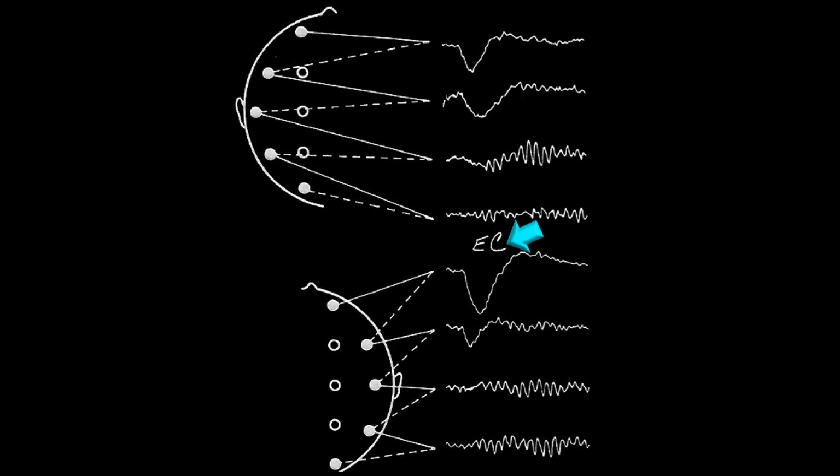In this frame, you can see the classic presentation of eye closing. It is a downward deflection in the anterior-most electrodes when we use a banana montage. Simultaneously, you will see that with eye closure, alpha activity will occur in the posterior channels, usually bilateral in normal people.